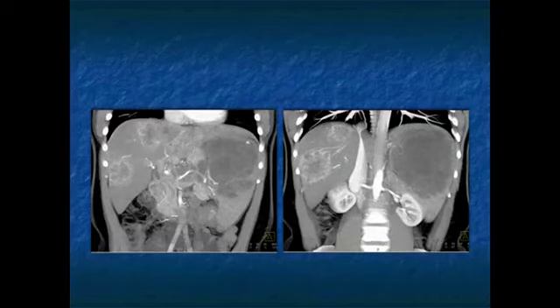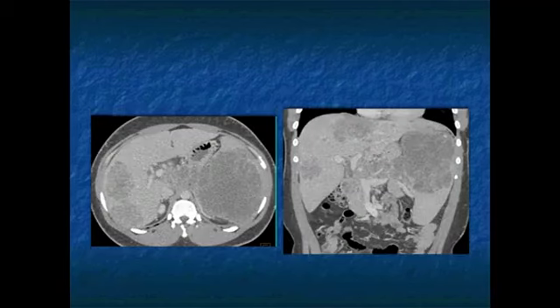As you go to later phase imaging, the necrotic changes in the liver and particularly the splenic lesions are in fact better seen. So lymphoma is a thought, liver and spleen, though the liver lesions are a bit unusual. Metastasis like melanoma is a good thought. You've got to be thinking malignancy.